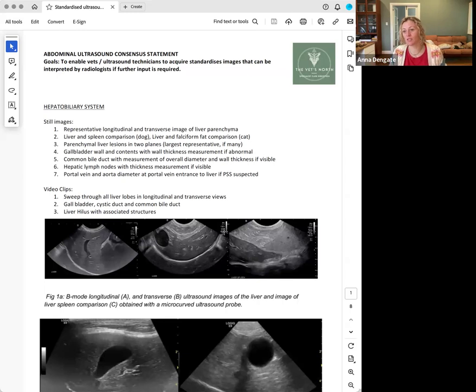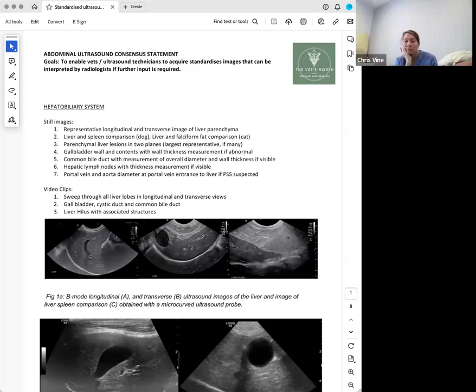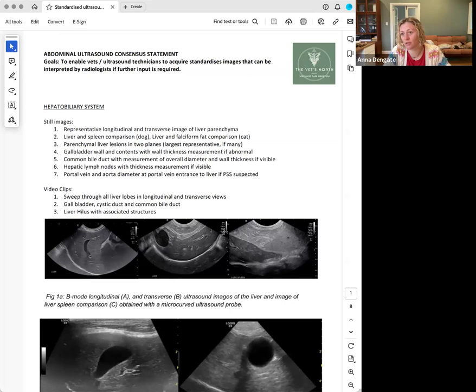Basically when you've got a big liver, there's more stuff in it, right? So when you think what's the stuff, it could be cells, in which case we call it infiltrative disease, which is kind of a dumb term because nobody really understands what we're talking about. But when we say infiltrative disease, it implies cells that are infiltrating through the parenchyma rather than forming discrete mass lesions. So that could be inflammatory or infiltrative neoplastic disease. So what neoplastic diseases are infiltrative rather than focal mass lesions? Lymphoma. Lymphoma is the main one. Yeah, exactly. So that's the one we see most commonly for sure.